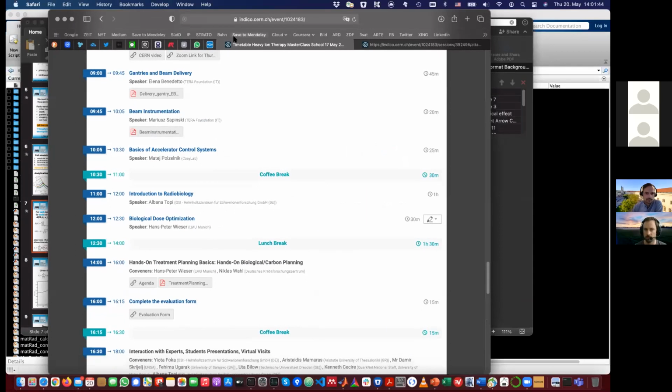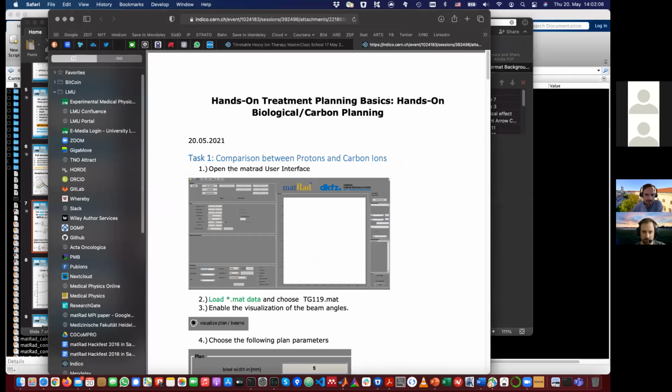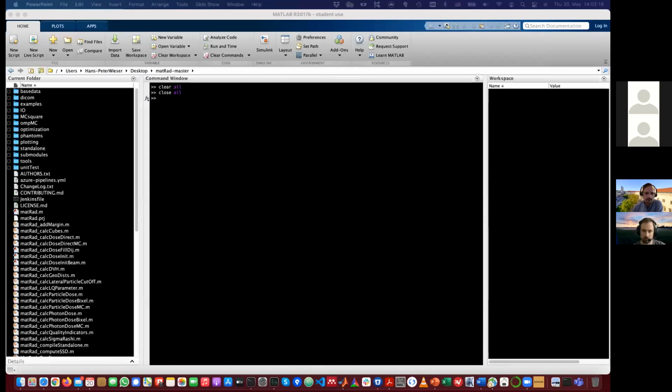So please go to the Indico page, and under today's Thursday, there's again a handout for today, which is somehow magically linked now also to the Tuesday handout. But anyway, please open this PDF, and then you can download it, and then you will find all the steps that we're going through in the next 1.5 to 2 hours. All right, so let me move all of this aside.